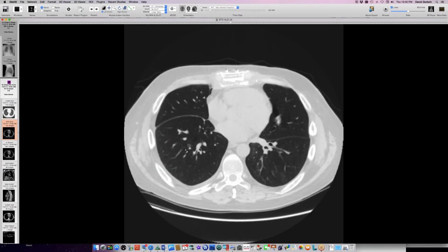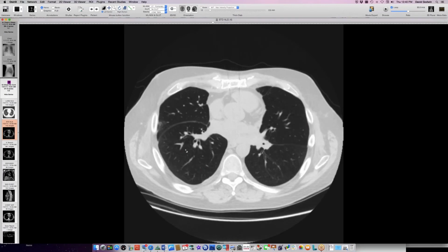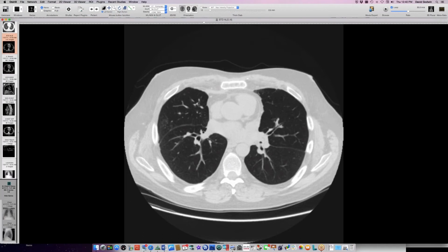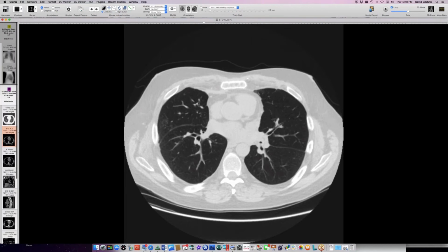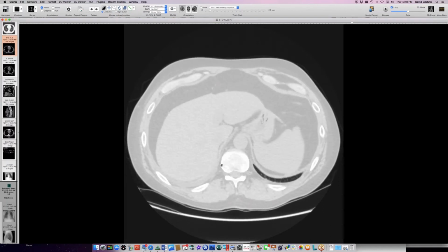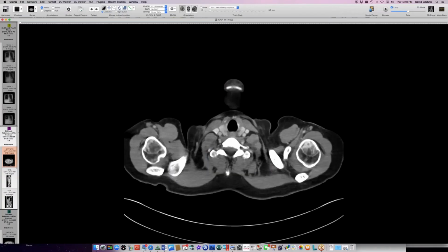That's interesting. Now, David, what was the time frame after clamshell sternotomy? Years? Well, I was wondering whether there was another procedure here, but this happened between 2016 and 2017. So let me go back to the original radiograph here, maybe a different set. Let me pull it up.